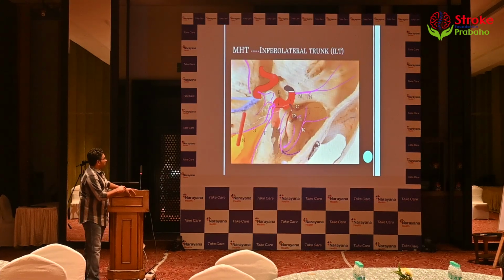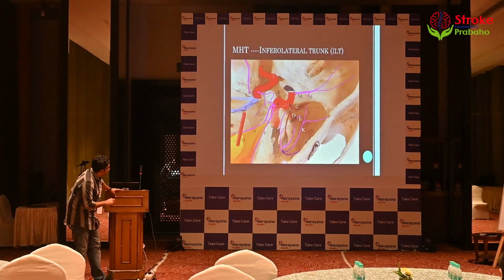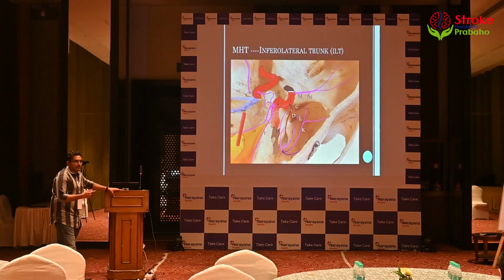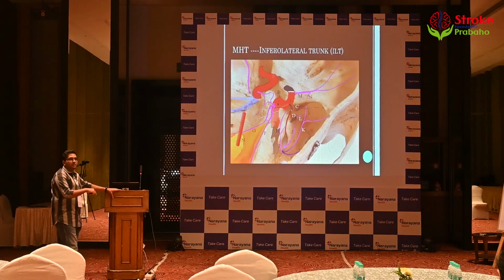Again, the representation of it, if you're able to identify it. So what do you think this would be? You can attempt, I mean, I don't know the exact answer. So it's going in front, so it's somewhere into the ophthalmic system, right? So it could be the DOA or something like that. We don't know for sure. But what are we sure about? What about A? Can anybody tell me what is A?